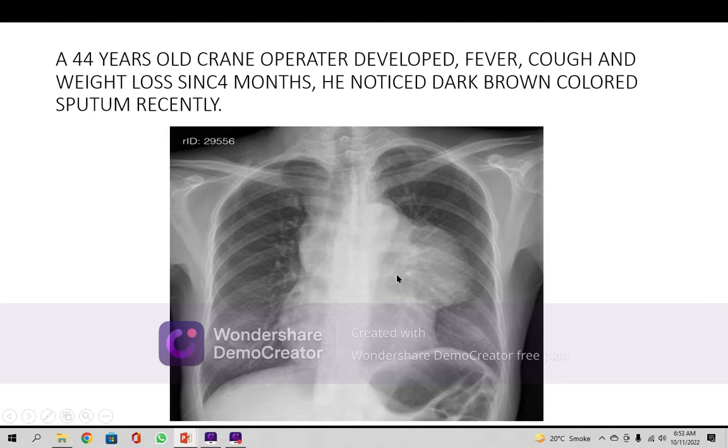So the thing is this: if it is found to be a mesenchymal tumor, then we grade it, and then clinical staging should be done. Looking at this clinical staging, the size of the tumor is big, so it is a T3, and lymph nodes are not involved. I have not seen any lymphadenopathy here, and metastasis is not seen again.